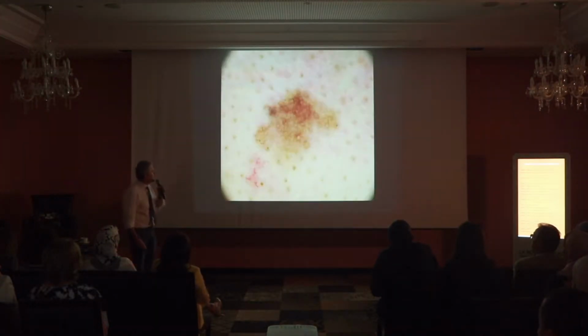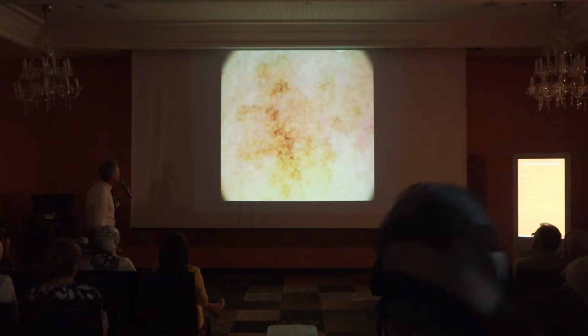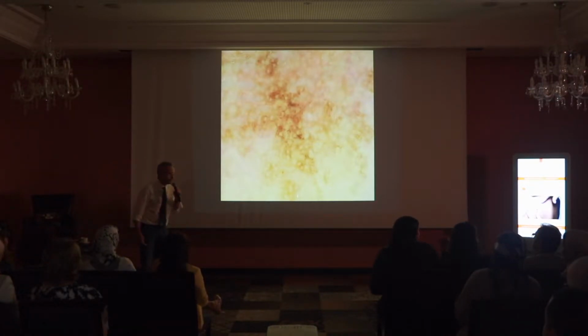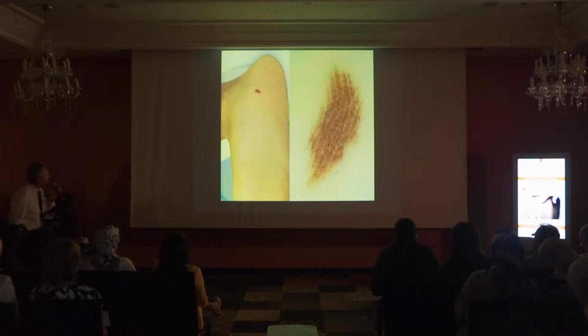Number 3. I give you also an enlargement. Okay. This is 3. 4. Okay. Enlargement. 5. Easy.